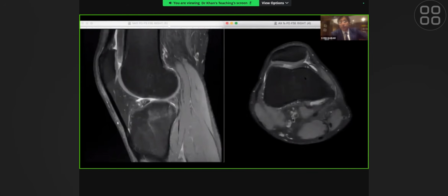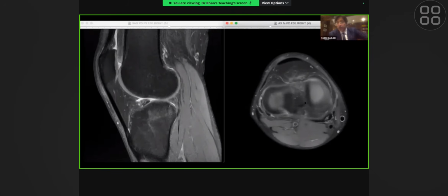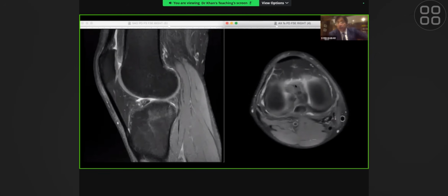So if I quickly run through it, I know we push for time, you can see the cartilage is nice and smooth, so there's no chondromalacia patellae change, but I can certainly confirm the femoral attachment of the MCL. So that's really gone, or in other words, not gone, but edematous. So that's damaged. You can see the ACL in there, you can see the PCL in there. It'll actually give you a lot of information. And this is where the problem is, which we think is probably an avulsion fracture.